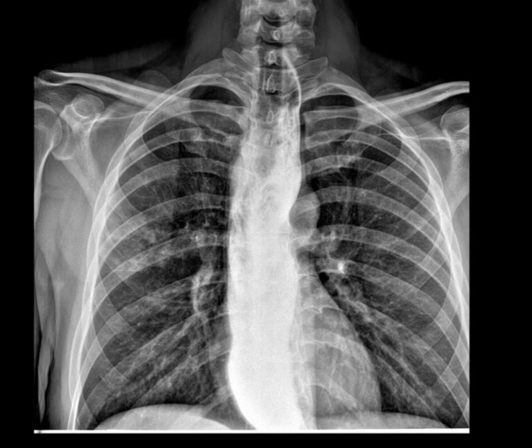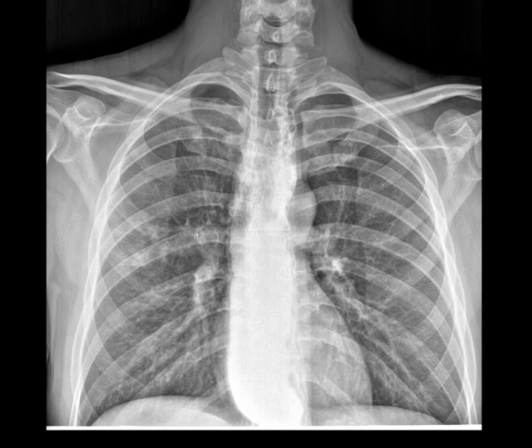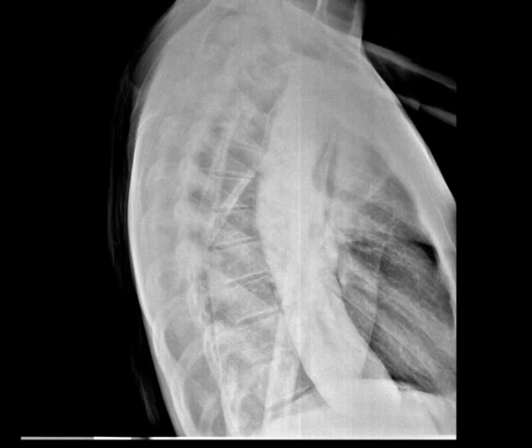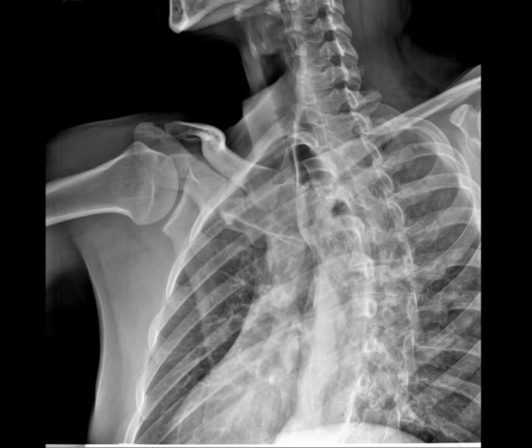Showing dilatation of the esophagus. Good. Dilated esophagus, measuring maybe 4, 5 centimeters. Exactly. So why is it dilated? There should be an obstruction if it is dilated. There should be some sort of obstruction. Excellent. So where is the obstruction? Scroll.